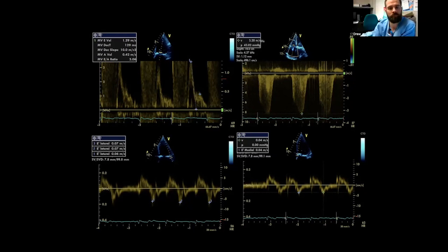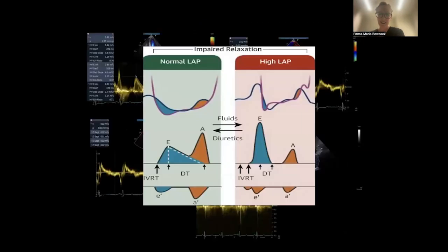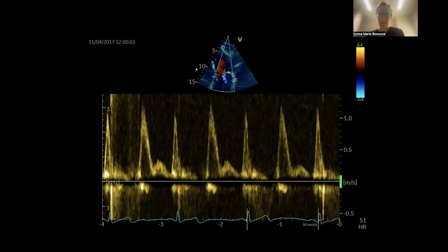Emma, would you see a possible L wave in the point that's marked as an A? Could that potentially be an L wave? Yeah, really nice question. It could absolutely be. I've actually got a still of an L wave, so I might just bring you along to that. That's an L wave.